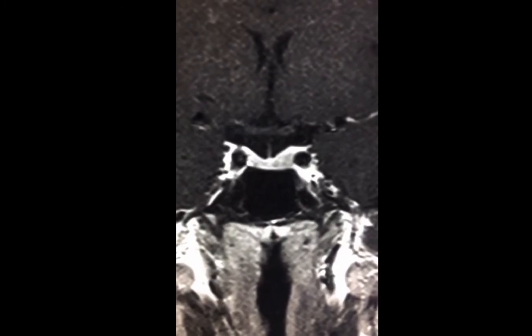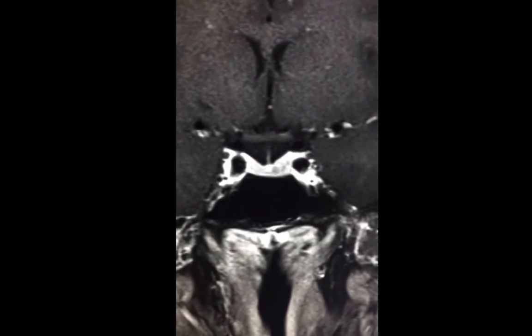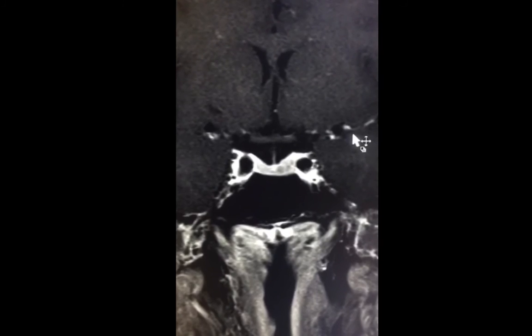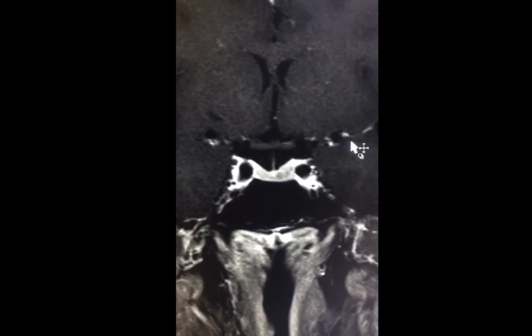However, look what happens to the microadenoma as we proceed. So we're going to the next enhancement slide, the one after, and the one after. Even microadenoma would enhance if you give it some time. So if you only acquire a late image, it might be difficult to see such an abnormality.